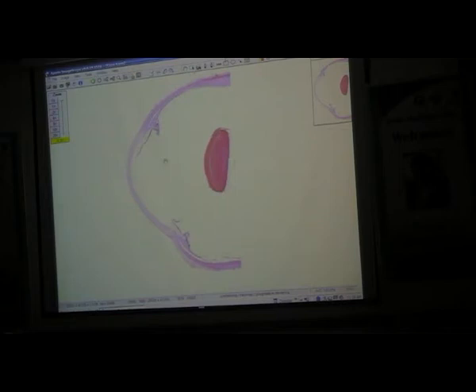Now it turns out that because I was told there was a retinal specialist in the audience, I need to talk a little bit about retinal pathology. Now this has a particular name in ophthalmic pathology. It's a peculiar German name. It's called a Ringschwiele, kind of a funny name, which is a little proliferation of retinal pigment epithelium at the terminal margin of a retinal detachment. But because we had a request for a little extra retinal pathology, I would at least show you what a demarcation line looks like. You know, I would like to do a very, very quick case for you, just a little bit to review. It will take us just a moment or so.